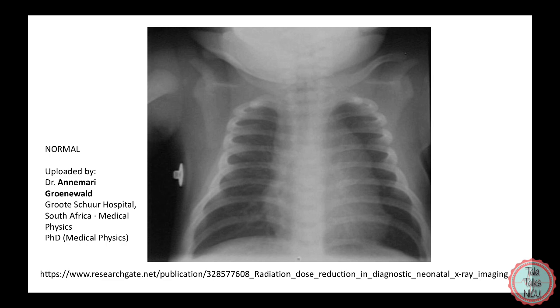Also, as you know, most of the heart is on the left side. In fact, 2/3 of the heart is generally on the left and 1/3 is on the right. Like we said earlier, if the film is rotated, then this may appear differently.